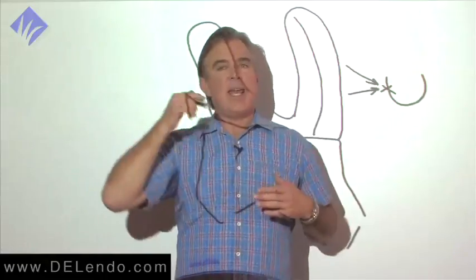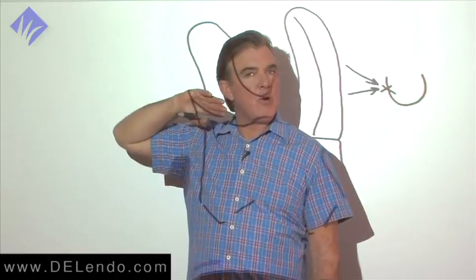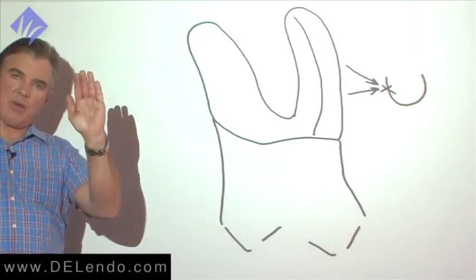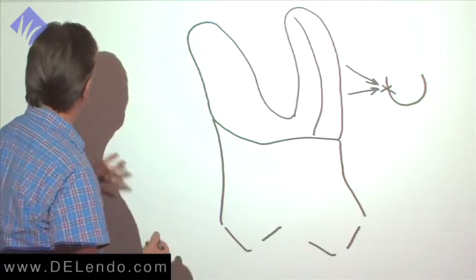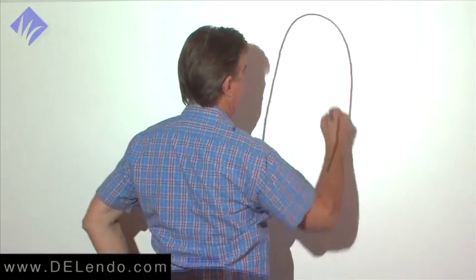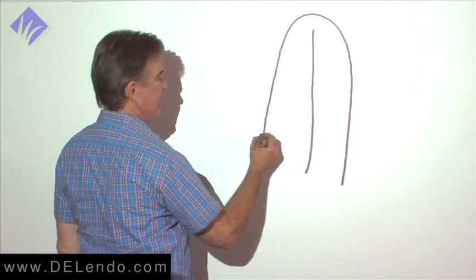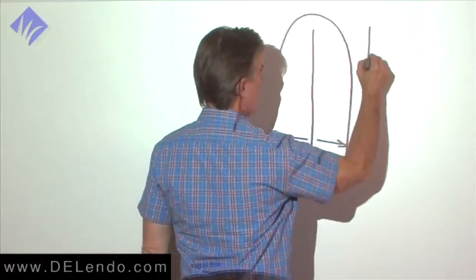But when we take the x-ray head and move it from behind the patient's ear forward, then we see the MB root going sideways. And then we see the file in it, and the critical factor is the file looking centered in the root. If we have a file like this, if the file's seen centered in the root structure from side to side in this angled view, we have one canal.